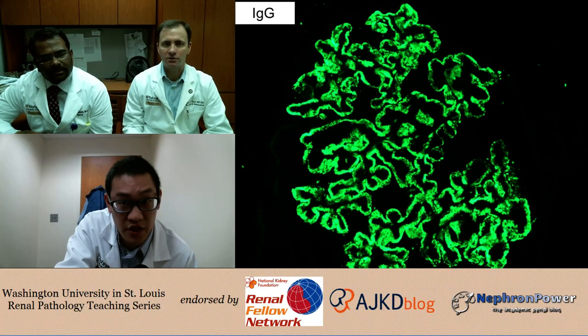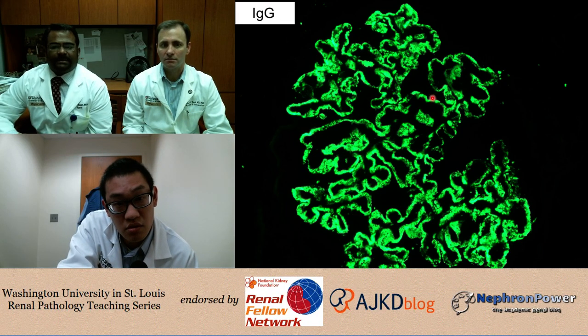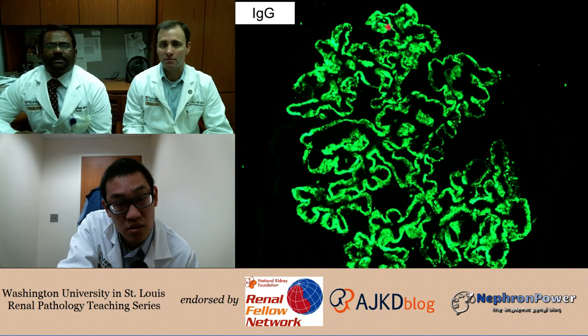Here we go. That's a much nicer picture. Okay. So you can appreciate the granularity here much better, and it really is staining in the capillary loops.